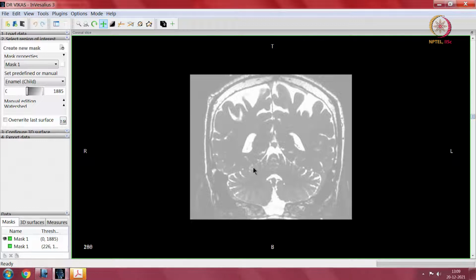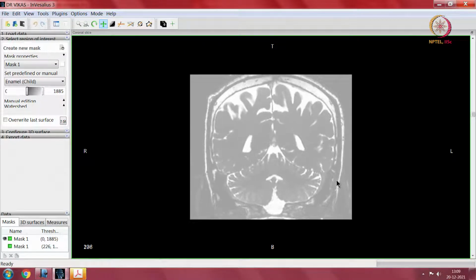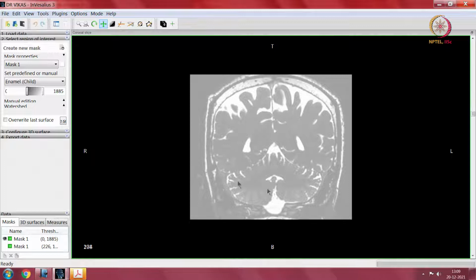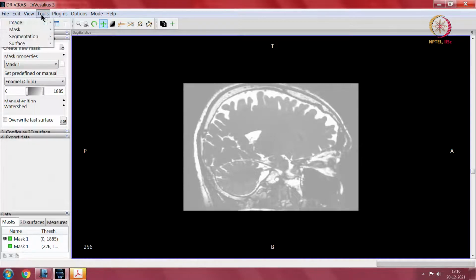Okay. Here, maybe a little clearer, is the uvula, and how do I get the tonsil? Tonsil is in the other direction. I think that is the clearest view of the uvula in the center and the tonsils in the periphery, the cerebellar hemispheres. So, that is about the coronal section for showcasing. I need to flip anterior to posterior.